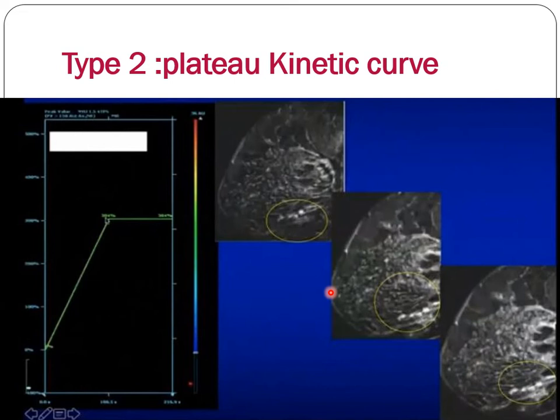If you have multiple images, then you say dynamic. Like here, if I show you one image, you don't know whether it's dynamic or not. You say just T1 fat saturated post contrast subtracted sagittal or axial breast MRI image. What do you know? That's your job to know. As long as it's post contrast, it must be T1. As long as it's T1, it must be fat saturated. Why? Because it's subtracted. Okay.